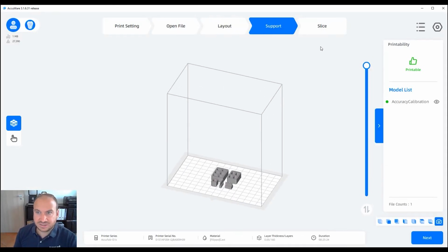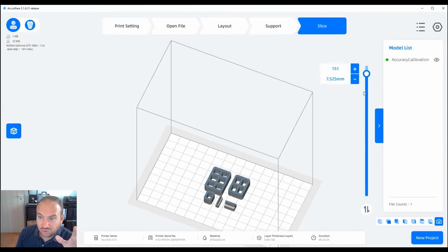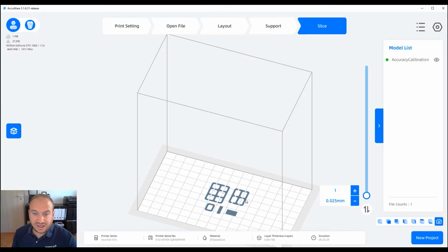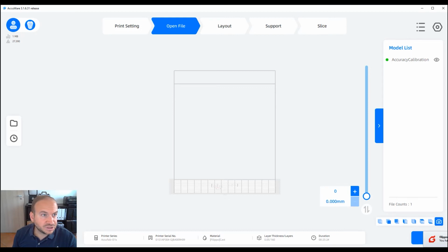Yeah, as I said, once again, it's really important to get practice, and one of the most important things related to the research of a new resin is your experience. Not for this object, but especially for the dental model or for the dies, it's really important to check the thickness of the support. I spoke with different customers who were not able to print properly because the support was too thin. So let me import a dental model just to make a clear example.